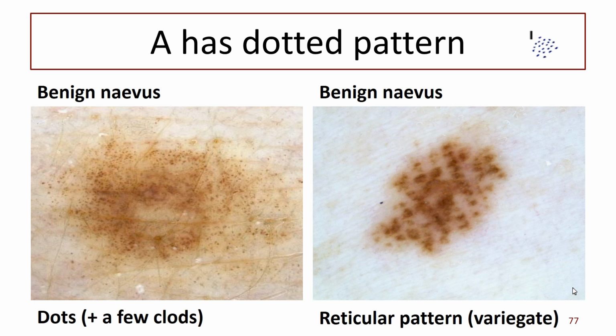Yes, actually, you probably can't. The lines are very fine in that one. No, this isn't. You will see more clearly that the clod pattern has a very distinct edge to it. You see how Emily's done a very distinct clod here? There's no question about it. This is kind of vague. And do you remember we saw that other variegate nevus? It was a grey dotted pattern. I know this is a reticular pattern. It's just the pattern of the nevus.